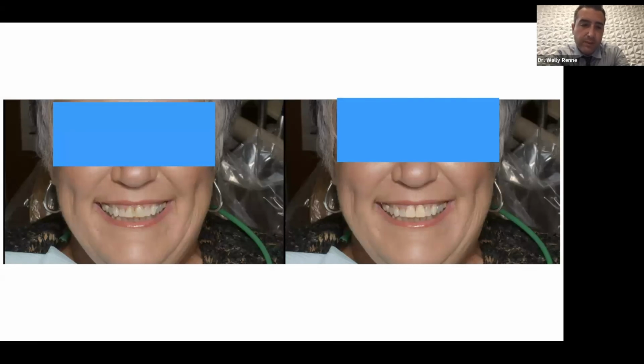And so I humored her. I said, okay, yeah, we could do 2 veneers there, no problem. But before we start shaving down your healthy tooth structure, let's take a look at what it would look like. And so I mocked up 2 veneers in Romexis Smile Design on 8 and 9. And she looks at them and she's like, why are they dark like the rest of my teeth? And I said, well, we're just doing 2 veneers, so we can't brighten them, because if we brighten them, you're going to have 2 fluorescent teeth in the front. And so I actually used a slider that I'm going to show you guys and brightened them up. And she's like, oh, that's terrible. They look so fake and funny.